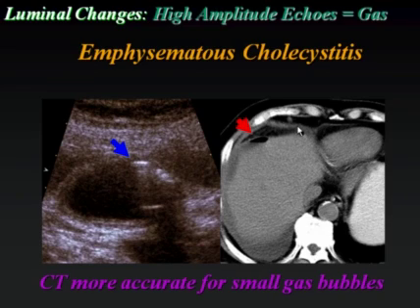Why this is important is that a simple percutaneous cholecystostomy is not going to be indicated here. This patient has already perforated and needs a lavage of the peritoneal cavity. So it's very important to stage the patient correctly, and CT is much more accurate in this regard.